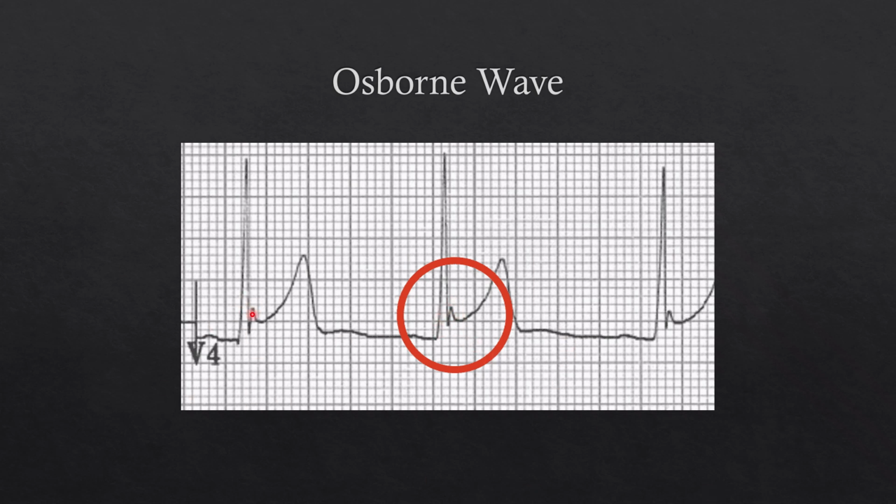Again, if you see that going into ST elevation, it doesn't completely rule out that you have that transmural injury pattern, but it's much, much, much less likely, and you are much more likely to be dealing with pericarditis or BER. So we want to take a moment, do some more investigation, and see if that's truly what we're dealing with.